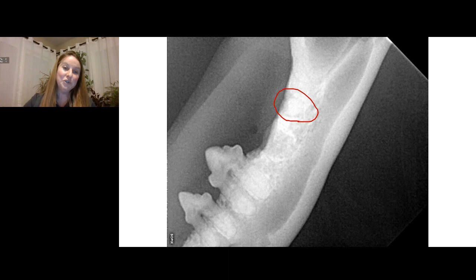But as you start to look at all of these cat mandibular teeth, especially these mandibular cheek teeth, and everybody has this love-hate relationship with cat teeth. As soon as you start to get familiar with cat teeth, you might love them a little bit more, because when we start to look at these, we can say, okay, if I section this tooth here, I know that this root goes in this direction, and that might be how I extract it. This one kind of in this direction, okay? But then we look here and we say, oh, this one's going to need to be extracted in this direction. And I'm not saying these roots need extracted, but I'm saying if they did.